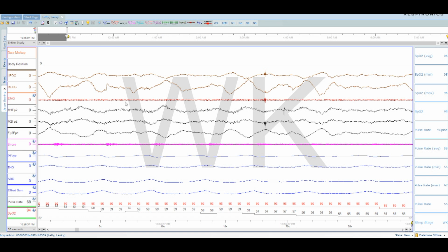Let me get to this first. A lot of techs watch this channel, and a lot of them are starting out, and they don't really have confidence in how to score. So I like to show that, but I also like the transparency, so you guys can see, yeah, I did the study. This is what we're looking at, that kind of thing.